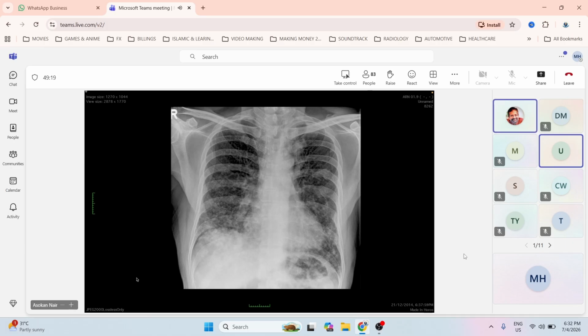Okay, fine. So you saw these lesions in the lungs. Why do you use the word reticular? What does reticular mean? The lines. Yes. Now you also said that this is likely metastasis from the thyroid, and why do you say it's metastasis? Because it's more in the lower zones and it's larger in the lower zones. Okay. So it's like a raindrop, small at the top and then gets larger and larger towards the bottom. So that's fairly typical of metastasis.